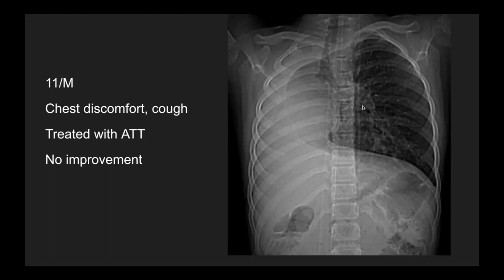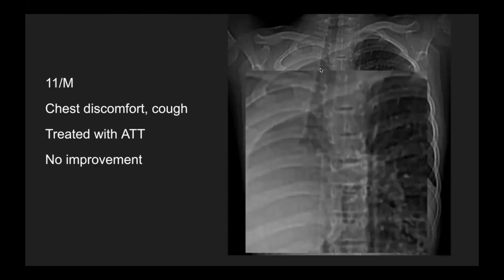If we look at the trachea, now here comes the important point. We can see that the right main bronchus shows an abrupt cutoff. The left main bronchus goes normally. And at the end of the right main bronchus, we could see a meniscus sign, an inward bulge with a meniscus. So all these features would possibly point towards an intrabronchial lesion causing lung collapse.